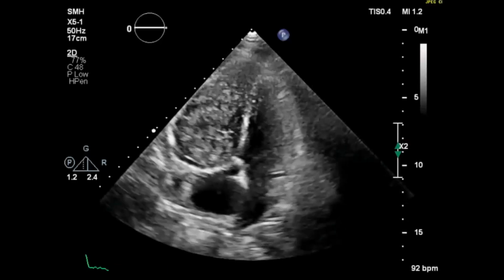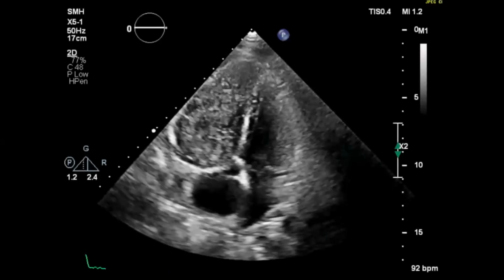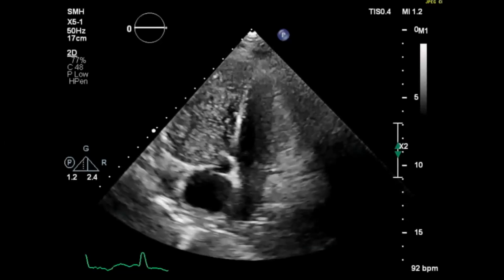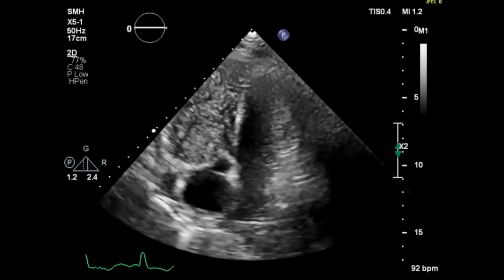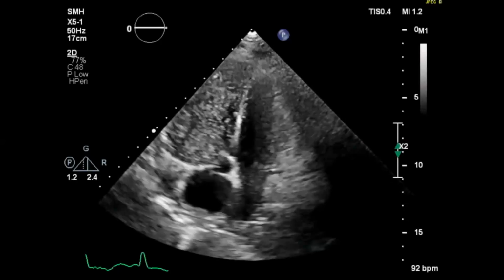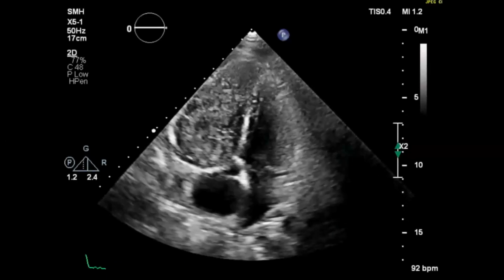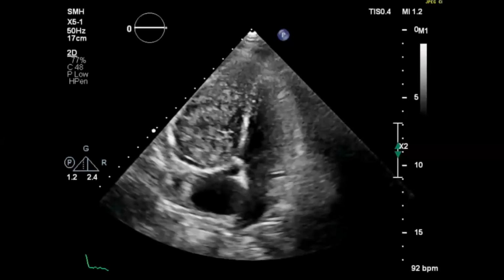Then there was one with contrast that essentially wasn't the best, but it shows there is partial vascularization of the mass when contrast was used. So it is again one of those cases where contrast can help with the differentiation, but she had a previous known history of osteosarcoma, so I thought it was an interesting one to show.